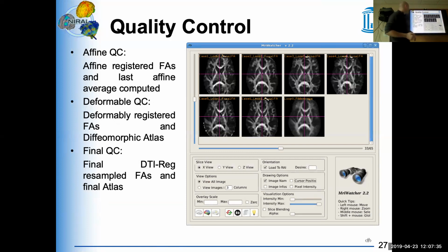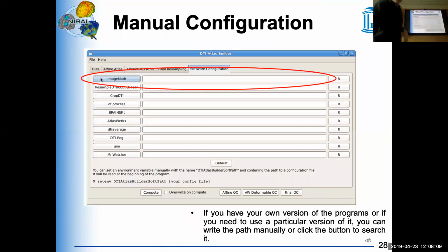And what you see here, so yeah, this is the affine registration. And at the end, what you should be able to see is that your average that is computed, this is the last image to show, should look exactly like all the others, because it shows you how the images have been mapped into the atlas. If our atlas building worked, you should actually not be able to detect any individual differences. It's not perfect, particularly on the outside of the brain, the folding of the different sulci and gyri. It will not be perfectly able to restore those.